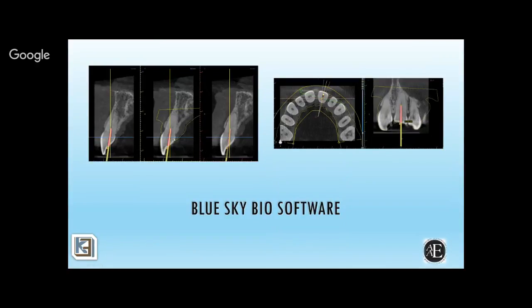So the way I do it is I create a custom implant from the edge of the model or my entry point onto the tooth to the point where I believe I'm going to catch a canal there. And that would be my total drilling depth inside the tooth. And then add to that the offset, and usually we would plan it directly right on top of the incisal edge.